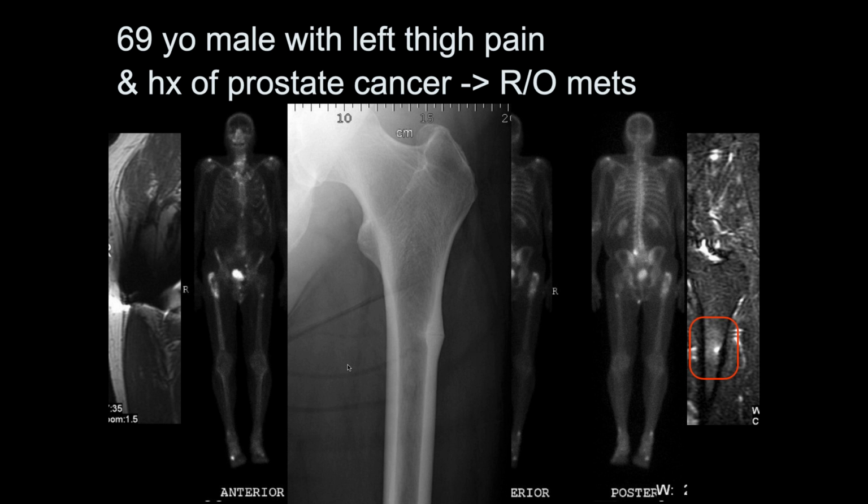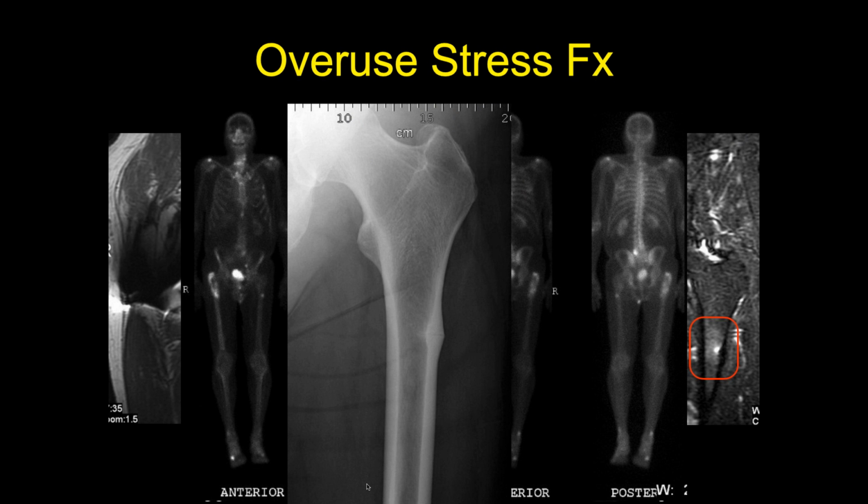I mean, this looks like kind of what we were talking about last time. This almost looks like where you get bisphosphonate type fractures. This patient was not on bisphosphonate. Yeah. Those typically start here. It doesn't really look like a met at all. So, yeah, overuse stress fracture.